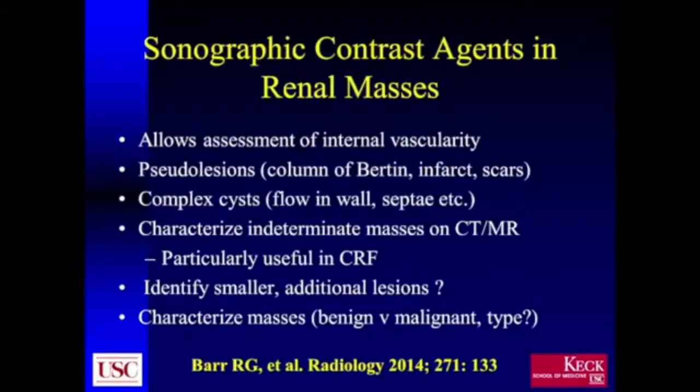So I'm going to talk about sonographic contrast agents in renal masses. What is it that we can actually do with these agents? Well, first of all, if we'd like to look at the assessment of internal vascularity for various reasons in the kidney, these are excellent ways to do that. It's obviously far more sensitive than Doppler, either color or power.